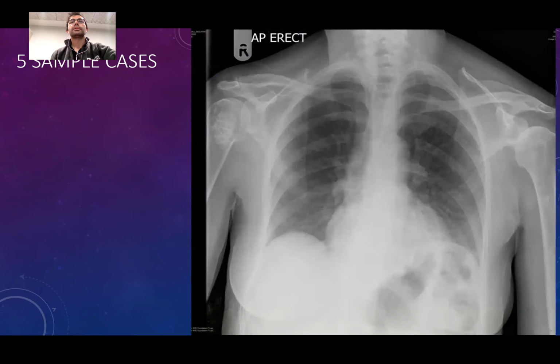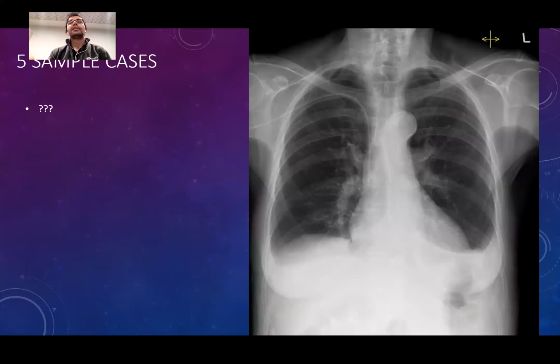Left lung apical lesion. What can you say to that? The left humerus, there is enchondroma. The right humerus. All right, you have watched the lectures, right? Okay, good, doctor. So we are seeing a lesion on the humerus here. On the right humerus, there is a bone lesion, which is definitely out of the scope of the lungs. This is some right humeral head chondroma or low-grade chondrosarcoma. It can also be. What about this one?